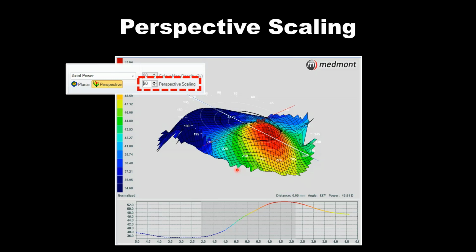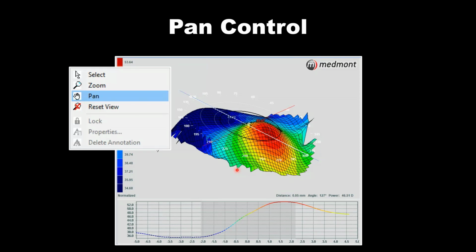I don't think this has value clinically from the perspective of, is this a diseased eye? Is this an eye that requires a corneal GP or a scleral? I don't think for any of these conversations it's worthwhile, but for patient discussions, I think this has great value.